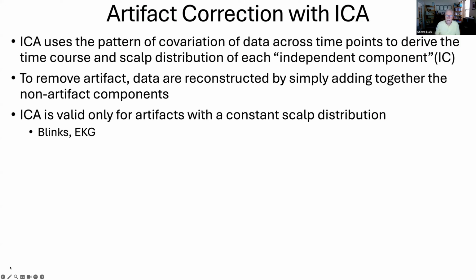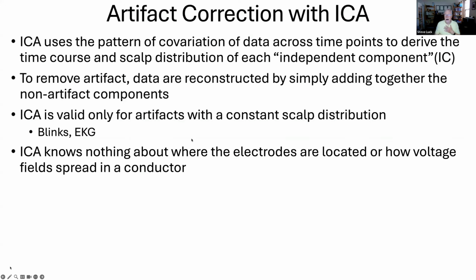Now, this only is valid if the artifact has a consistent scalp distribution for the recording session. So blinks, very consistent scalp distribution. EKG, very consistent scalp distribution. Muscle noise, like movement artifacts, not consistent. So it doesn't work with things like that.